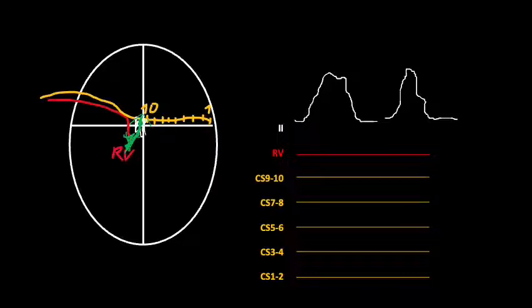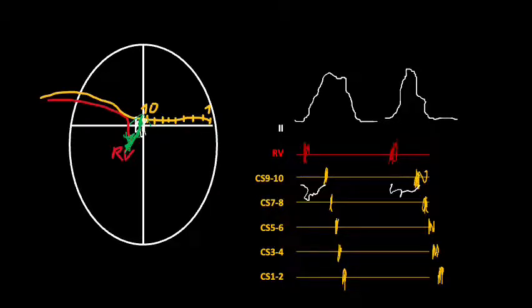So it means that in this case, when we've got the pacing with the wide QRS complexes and the pacing with the narrow QRS complexes, in both situations the interval from the pacing artifact to the activation of the CS is exactly the same, because in both these cases, SA1 and SA2, we've got the conduction through the accessory pathway to the atrium.